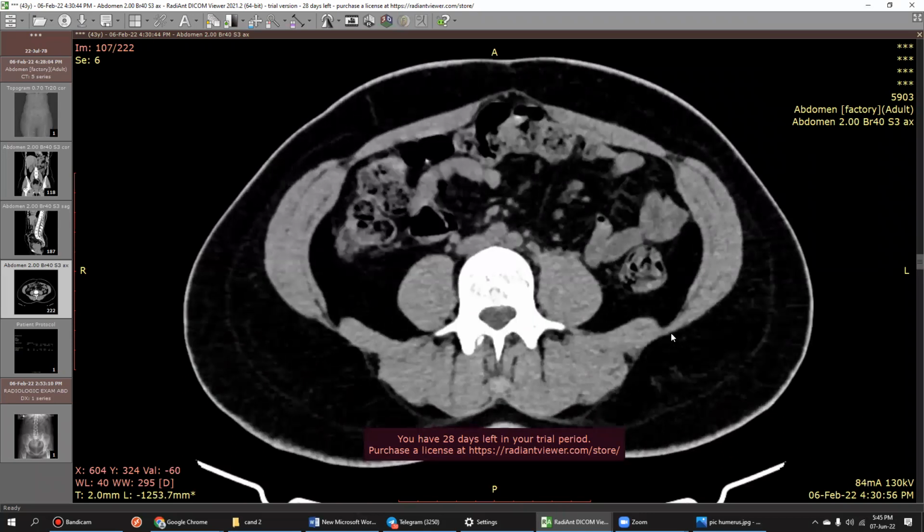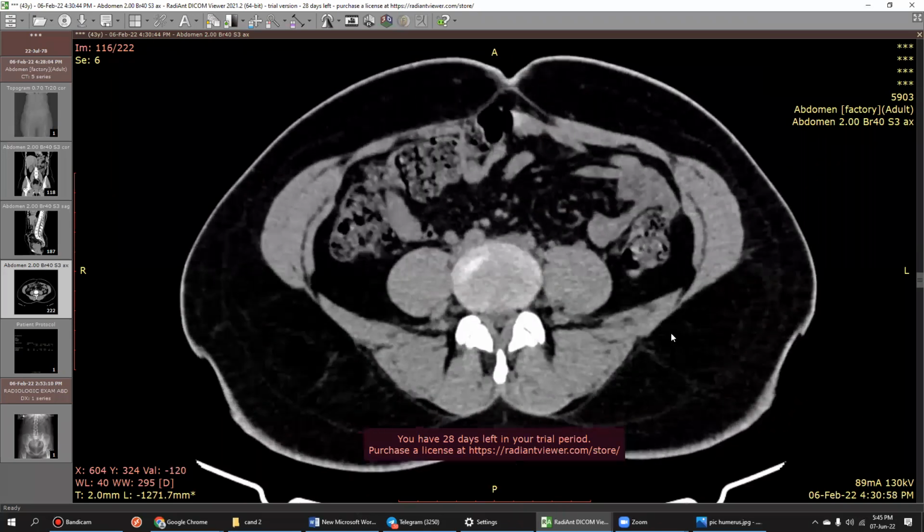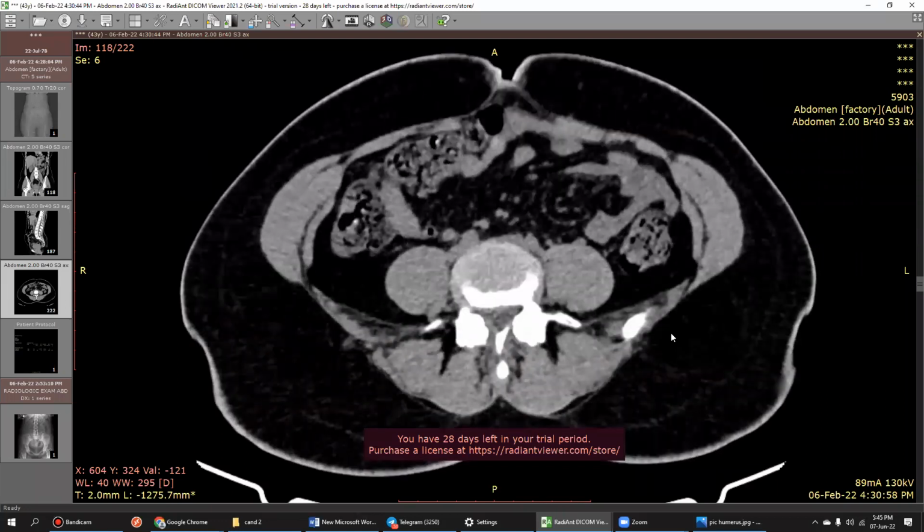Okay, I'm looking for any evidence of fat stranding, any lymphadenopathy, free fluid, any diverticulitis.